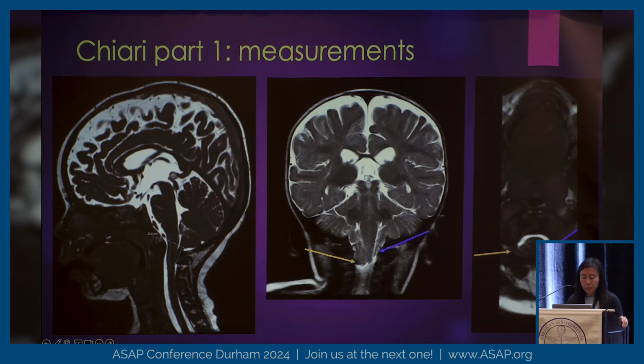In some patients, the tonsils are at very different levels. So then I would provide 2 measurements. This is a patient that, again, I draw the McRae's line, and you can see that it is abnormally long. Tonsils look pointed. But in this case, the right one here is fatter and actually goes further down, and the left one is not as far down but is very skinny. So this is probably one of the more extreme sort of differences that I've seen in tonsils.